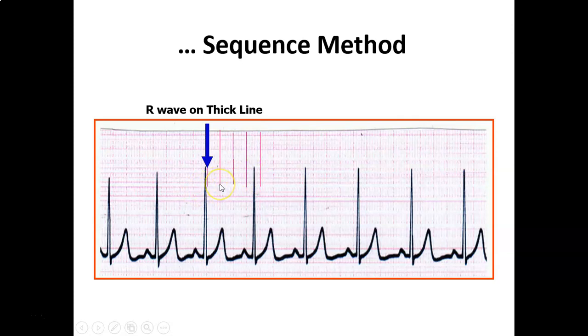So if it's here, the heart rate is 300. If it's here, 150, 100, 75. So the heart rate is between 75 and 100, so approximately 80 to 85.